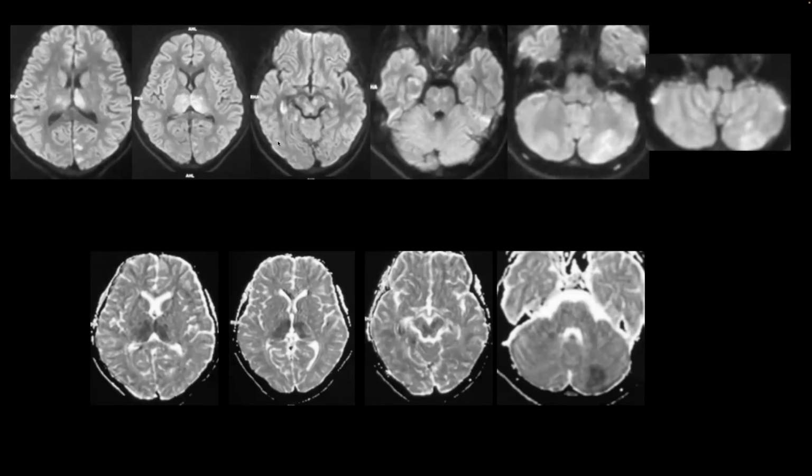Slightly atypical, going by the common, unless there is clear evidence on the imaging. We don't have an SWI. We don't have a T1. And ANEC usually has a more target-oriented appearance rather than the diffuse abnormalities on the various diffusion sequences. So typically the ANEC type pattern. Yeah, thank you.